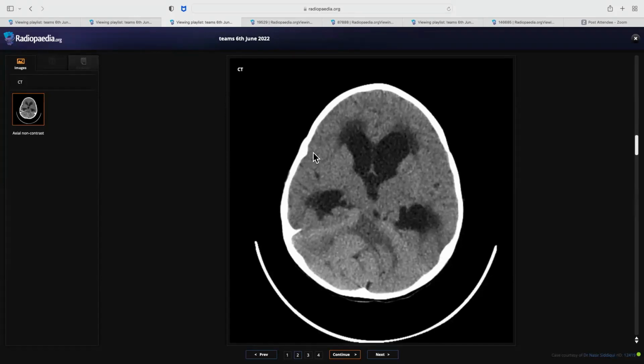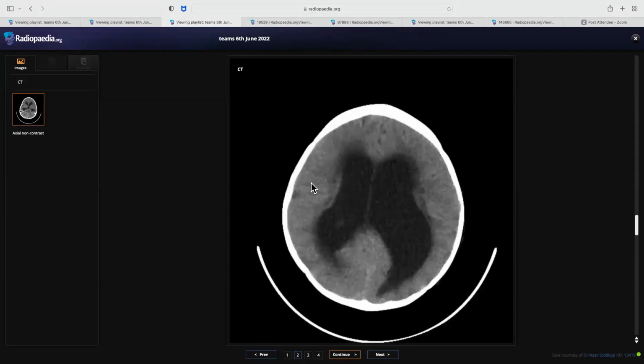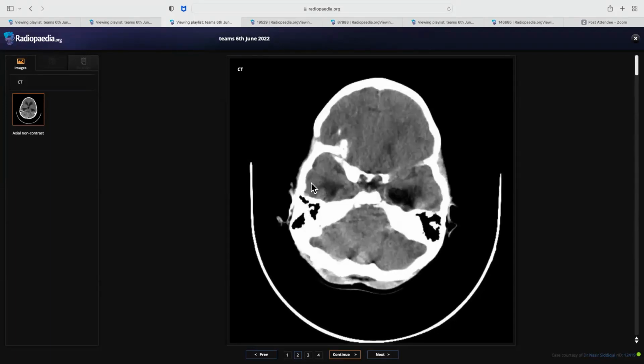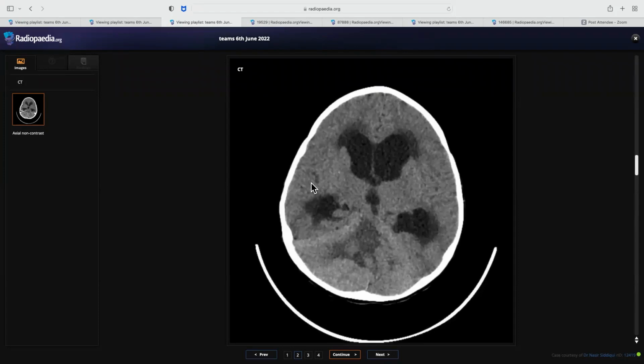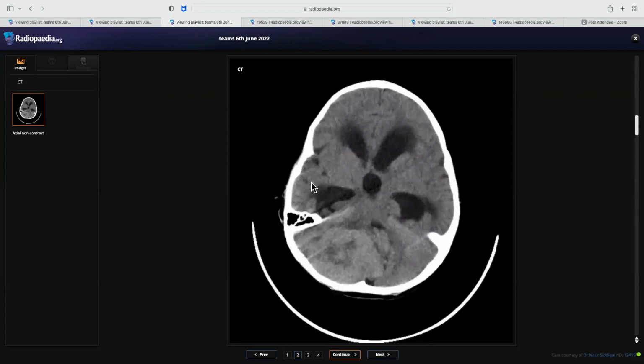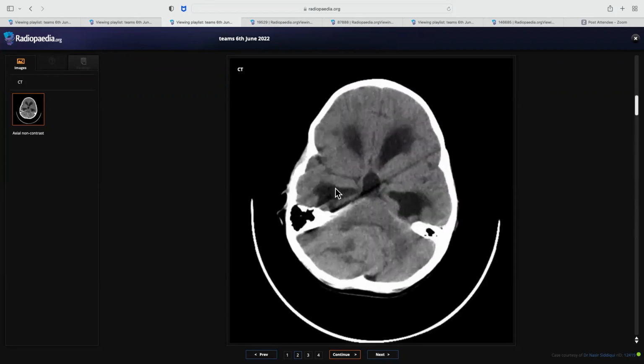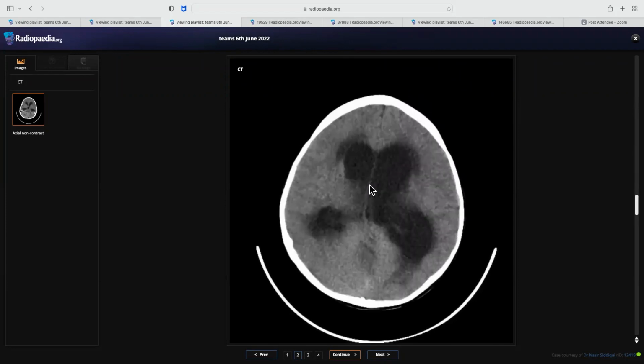It's absolutely fine if you take a few seconds before commenting, because in our routine practice also, we do take some time. We can't tell instantly, and they understand that. Even before saying medulloblastoma or ependymoma, once you see a mass, you can say there's a mass leading to upstream hydrocephalus. Then say that at this point I would urgently inform the referrer for management of hydrocephalus, because that's the urgent finding they are looking for.